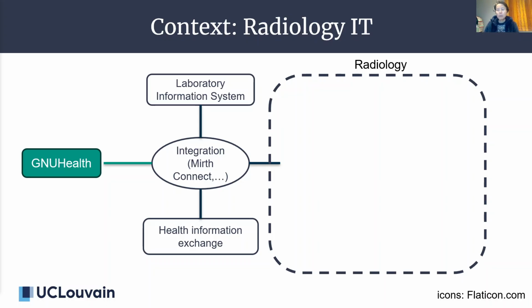Now, we want to look at what happens inside the radiology department.